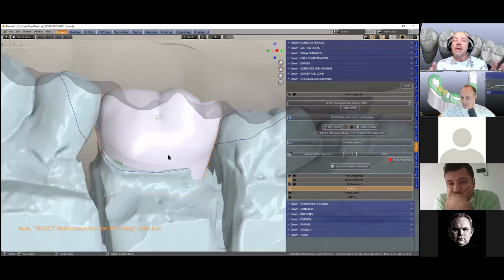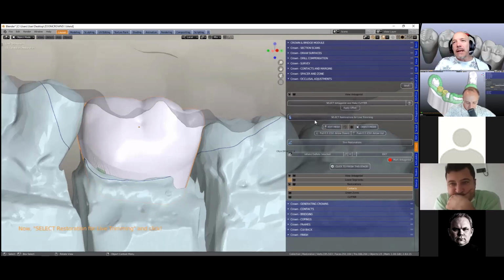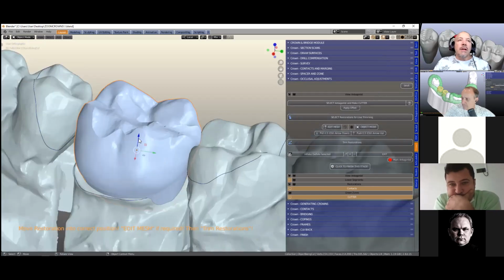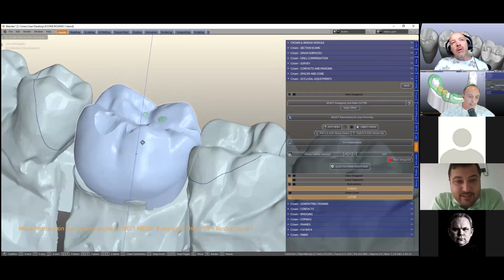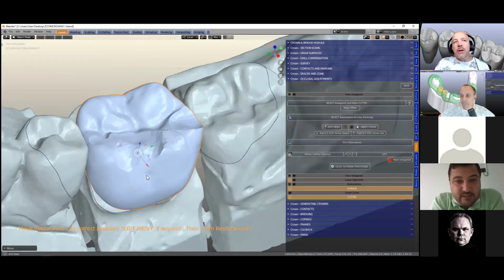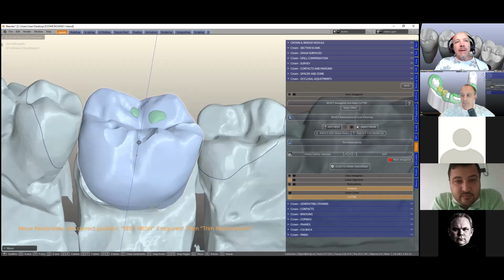If you've got multiple crowns, you'll select all of the crowns in one hit. Okay, we've only got one crown, we're going to select that. That's going to make it in blue. Now I call this live trimming because it's live. As soon as we move this crown, it trims as we move it, which is super cool, I think. And we don't want to lose the major anatomy of our beautiful tooth. You may have a fantastic tooth that you don't want to destroy. So here we get to set how, it's a compromise between the green zone and the actual occlusion. Although the green zone, we can adjust that over here.